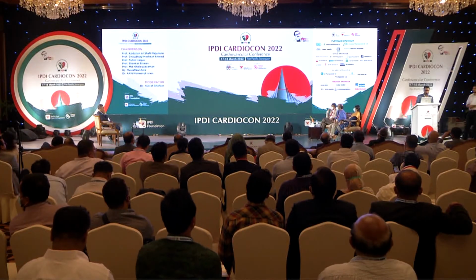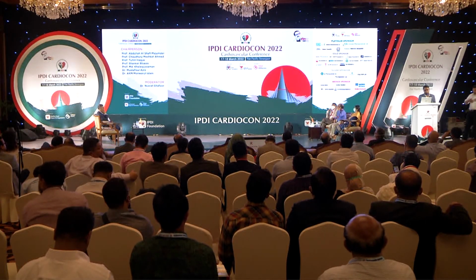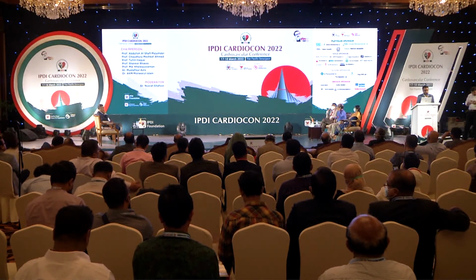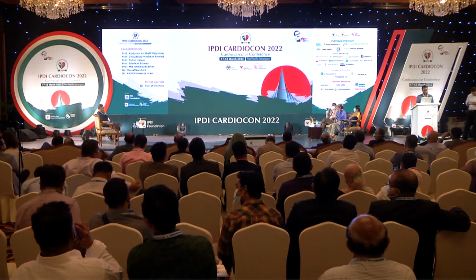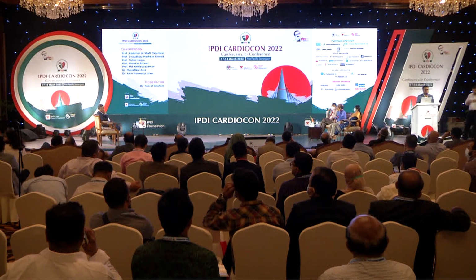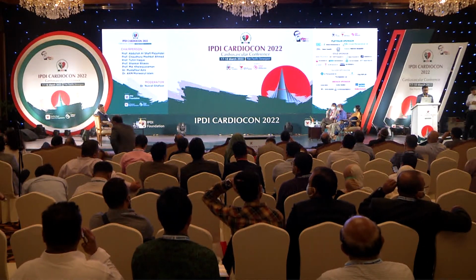They said, make a better mousetrap, and this mousetrap means enhancement. So let us do some enhancement and supplement the interventions. If there is any regional wall motion abnormality, we go for an LGE. If there is no LGE, go for revascularization. If there is LGE, then look at transmurality. If it is more than 50%, you don't need revascularization, go for medical therapy. For the rest of them, we can do low-dose dobutamine stress MRI, and if there is induced ischemia, we can do the revascularization.